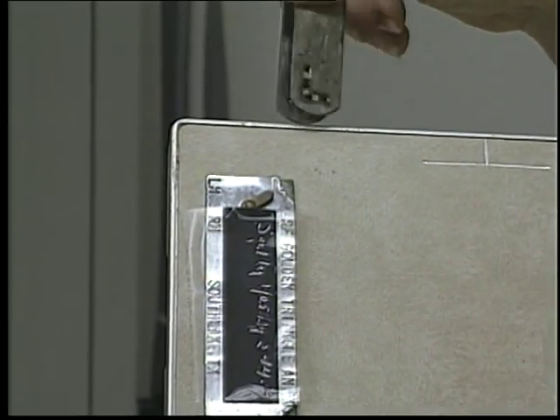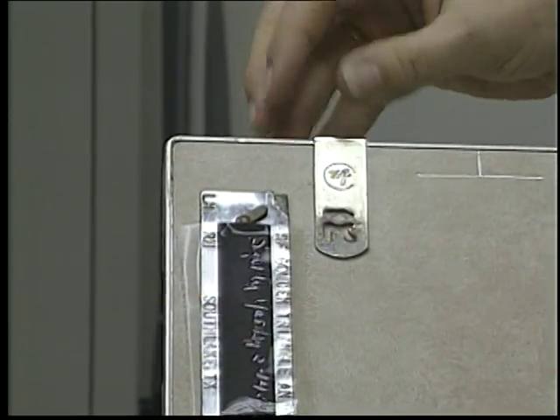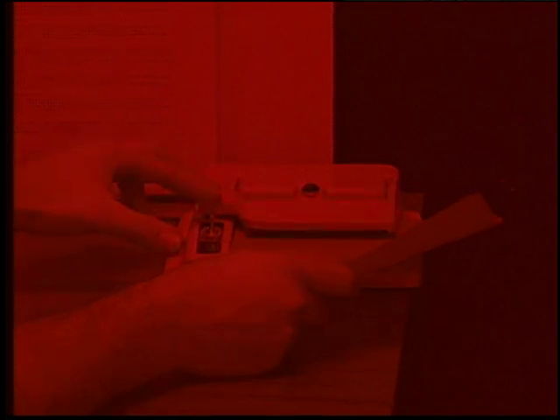Right and left markers should also be used to make the records accurate. All of the patient's information may also be light flashed onto the film prior to its developing with a light flasher system located in the darkroom.